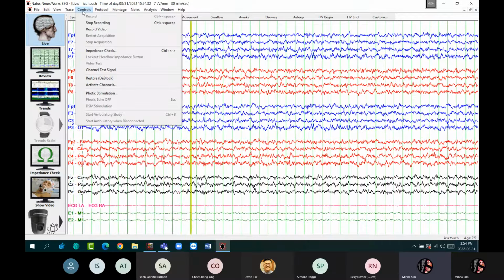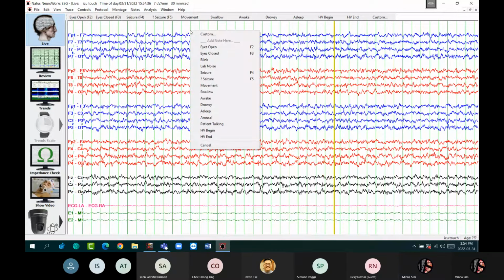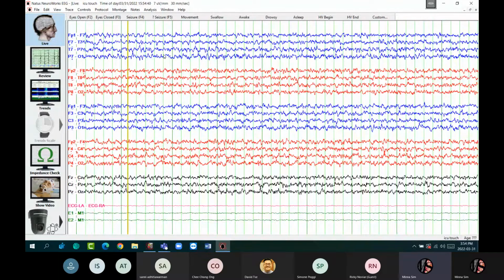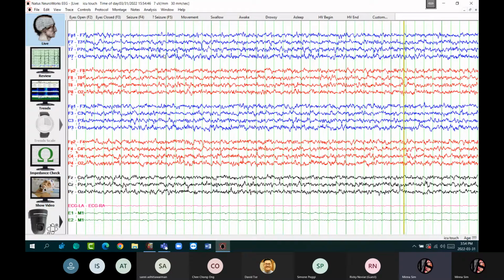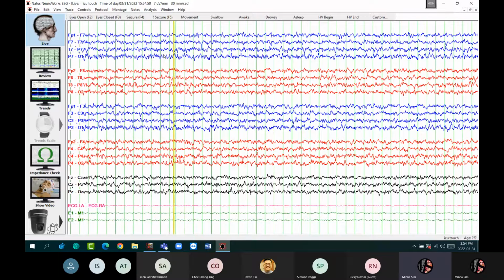It's already recording. Just like I mentioned, if I don't touch the laptop or the desktop for 10 seconds, and now I'm not touching my mouse at all, it should automatically switch to the trends summary.